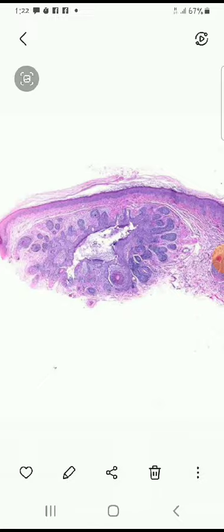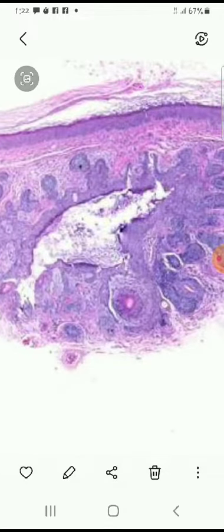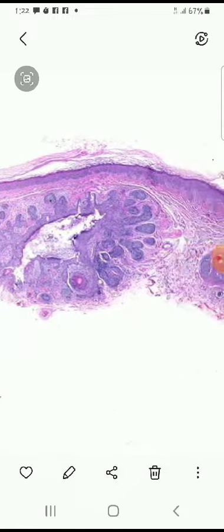This structure looks basaloid, in which the central follicle is dilated, forming a cystic cavity, and surrounding the same follicle, the smaller vellus hair follicles are connected to the central one, hence called the mother and the baby follicles. Each follicle is surrounded by a follicular sheath, and surrounding it there is connective tissue present in the dermis, and some infiltrate as well.